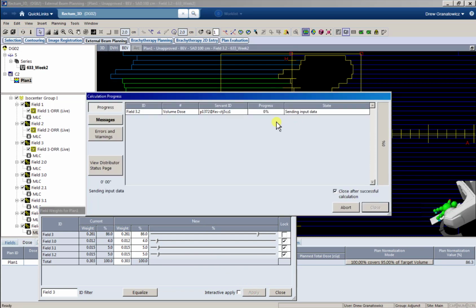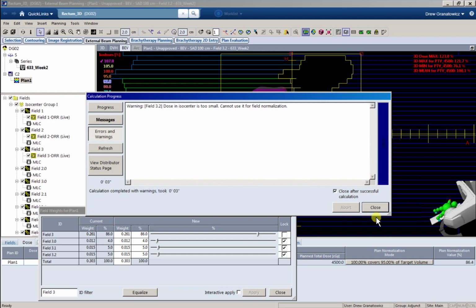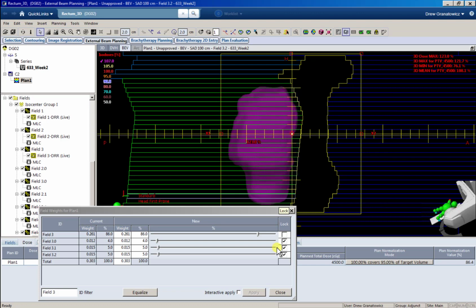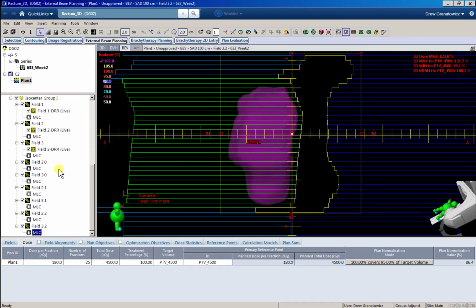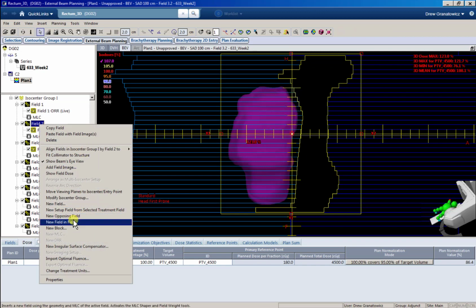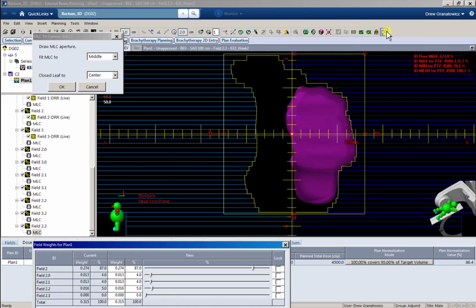I'm going to keep adding field and fields, just back and forth, left and right, until I get this 107 gone. So feel free to skip ahead in this video if you'd like.